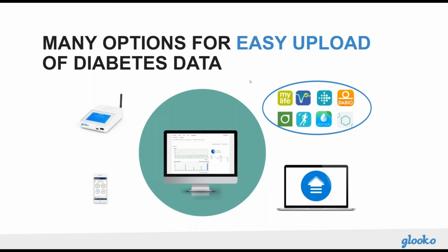And all of these 4 data sources feed into the main diasend platform, where we have the data visualized in a mixture of reports and charts that provide maximum information and really guide a consultation and give plenty of discussion points between a clinician and their patient.